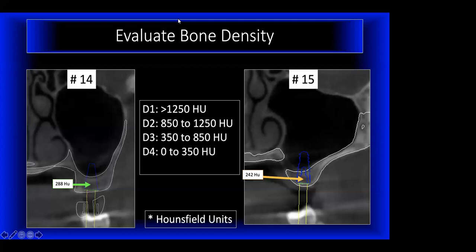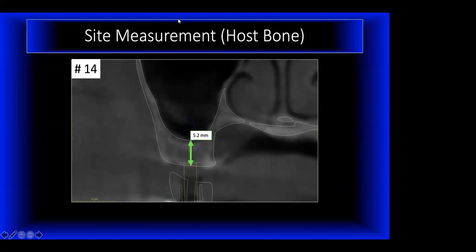So what am I concerned about? Number one, over prepping it. So we're going to do the same that we did on the last case. Surgically, we're going to under prep this, maybe even by 2 burrs. Or we're going to osteodensify it. Use osteotomes. Anything so that we keep more bone at the implant interface. Because remember, the cortical bone is what gives us the primary stability. If we do not have cortical bone, we then have a compromised primary stability.